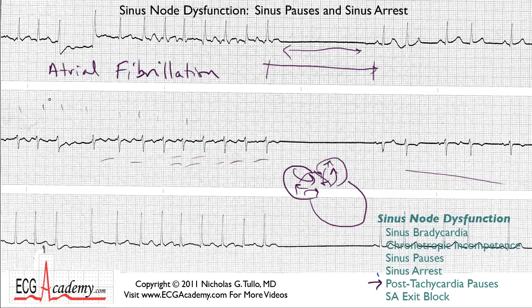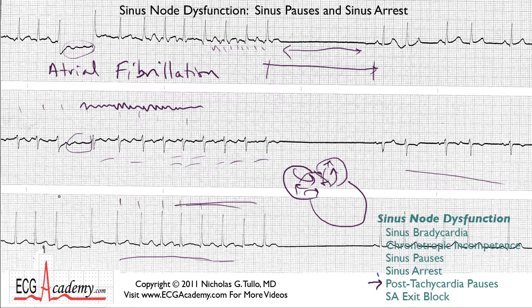And so instead of seeing discrete P waves, what you see is almost a continuous, irregular, chaotic electrical signal that's going on. And you can see some of that here and here. You can see some of these rapid, irregular signals here. And so what this patient has is atrial fibrillation, and the AV node is conducting these signals down pretty quickly. So you have this rapid heart rate somewhere in the range of about 150 beats per minute here. It's a little bit slower in this region, maybe 100, 120, but you've got this rapid arrhythmia, right?